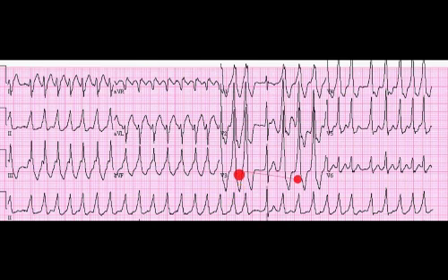and then we suddenly have the burst of ventricular PVCs here showing up in the middle of the tracing, just as we start to record V3 and V1 through V6. And these are very tall runs of ventricular tachycardia. Good.